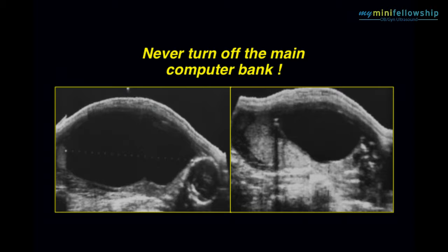Now, I've given you a while to see this screen, and I hope all of you are saying to yourself, now that's a case of polyhydramnios we can all agree with. Great, if that's what you thought, because, in fact, this is a case of profound oligohydramnios.